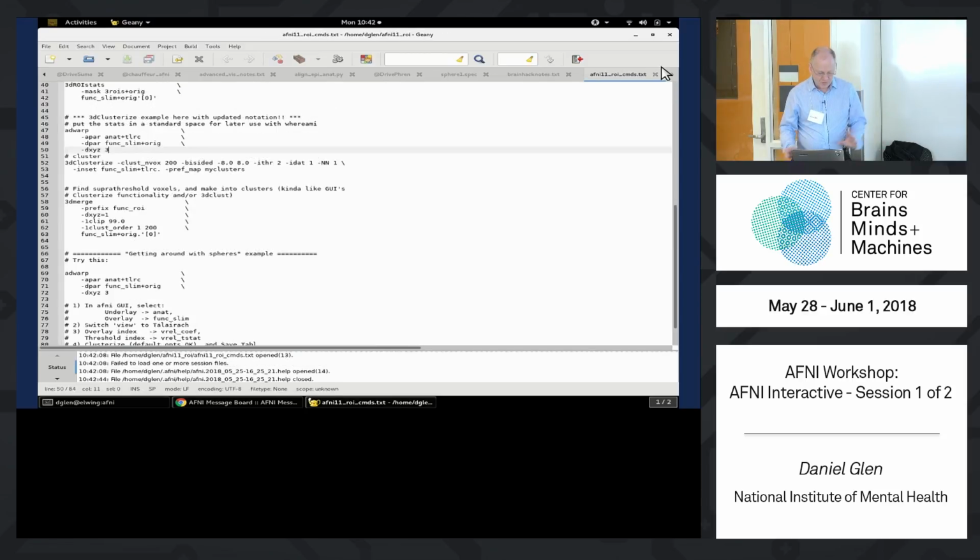All right, Rick has already shown you the 3dinfo command, another one of our 600 programs. AFNI is this collection of software, right? It's 600 or so programs written mostly in C, but we have a fair bit of Python programs and R programs, T-shell scripts, Bash scripts. There's a lot of different software that goes together.